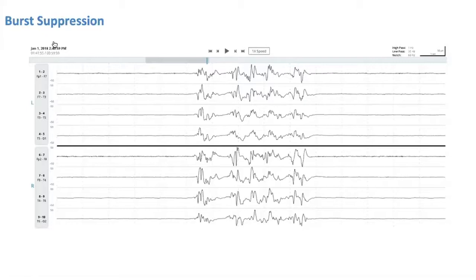And then I think that's a marker. It's a way of nicely and straightforwardly quantifying the severity of the cerebral abnormality. It doesn't go along necessarily with whether it's a seizure or not, but it goes along with the gravity of the cerebral dysfunction. And that's useful going forward for following up and seeing whether the patient is worsening or improving in terms of that cerebral dysfunction.